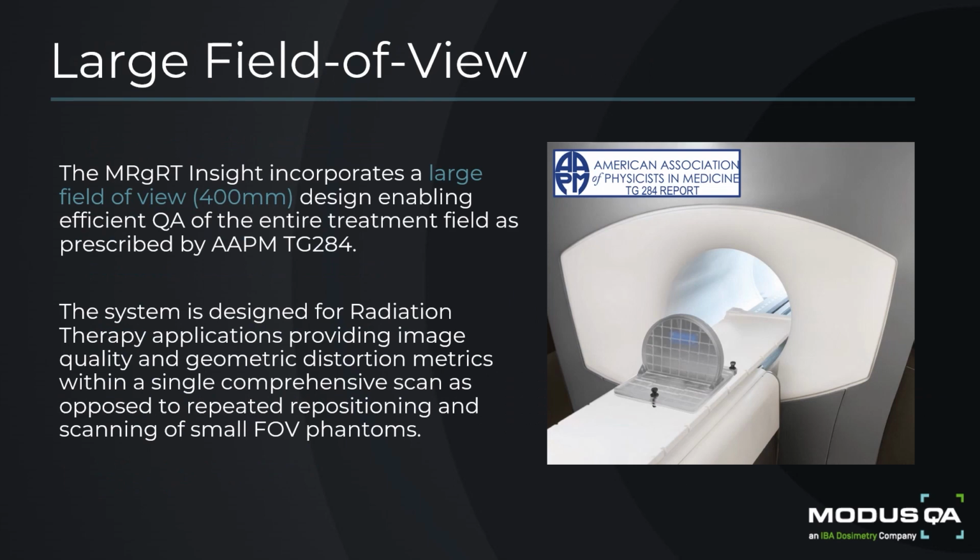And so, knowing these phantom attributes, what does it really mean for physicists and your QA procedures? Well, as listed previously, the Insight Phantom incorporates a rather large field of view of 400 mm that encompasses the majority of the treatment field as prescribed by the AAPM TG284 task group. This allows physicists to monitor key imaging QA parameters over a FOV that's suitable for a wider range of RT applications, including not only small field of view SRS cases, but also treatment of larger field of view SBRT applications, such as, let's say, the treatment of the abdominal and thoracic regions.